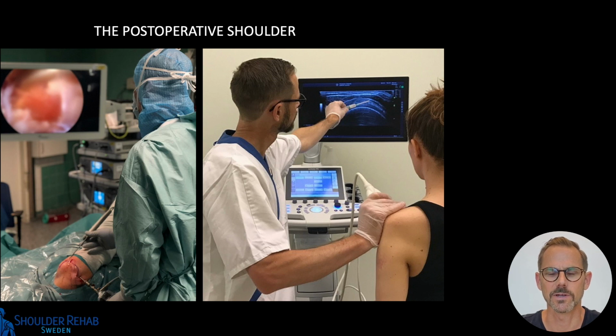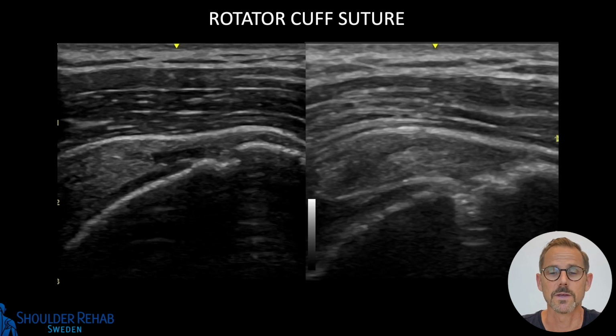Hello, today we're going to talk a little bit about the postoperative shoulder, which I see a lot in my everyday work at the orthopedic clinic. And I think we'll get right to it, starting with the most commonly referred patient to an orthopedic clinic postoperatively, which is the rotator cuff suture patient.